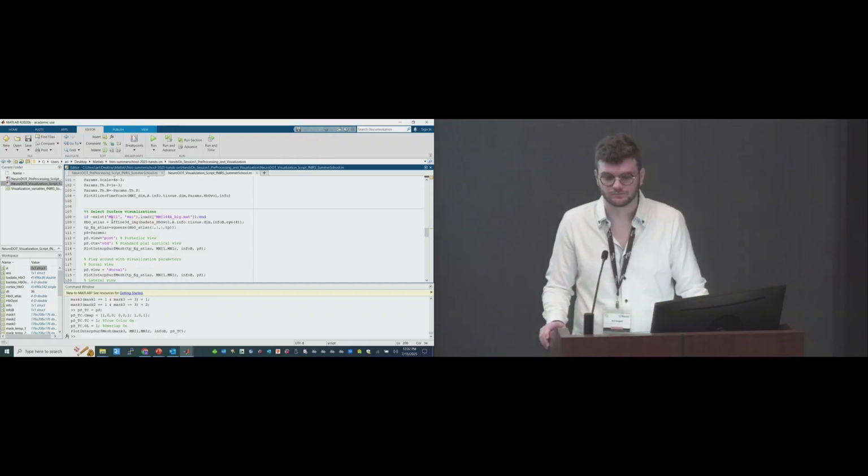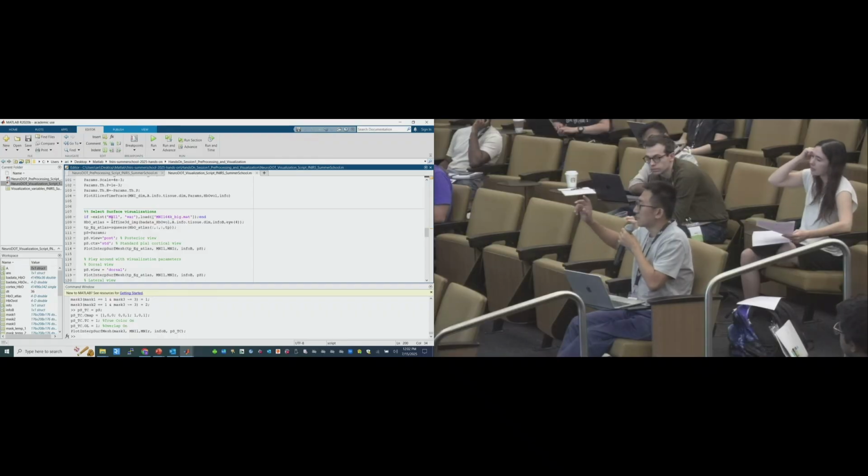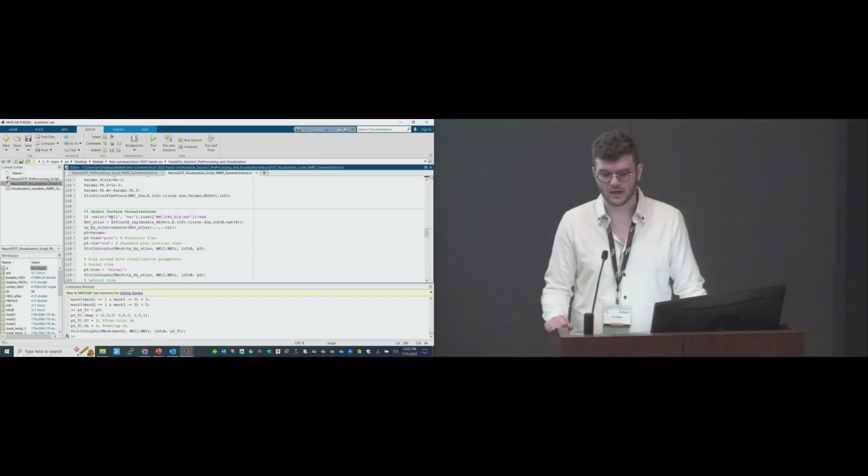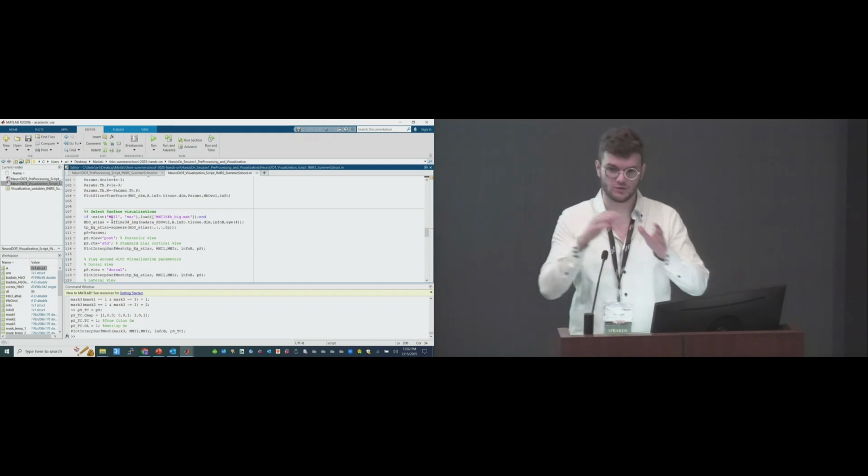Oh, so you can use part of the brain, like the frontal or temporal, but register it to the standard space? Not quite. You would be transforming your entire volume to the other space.